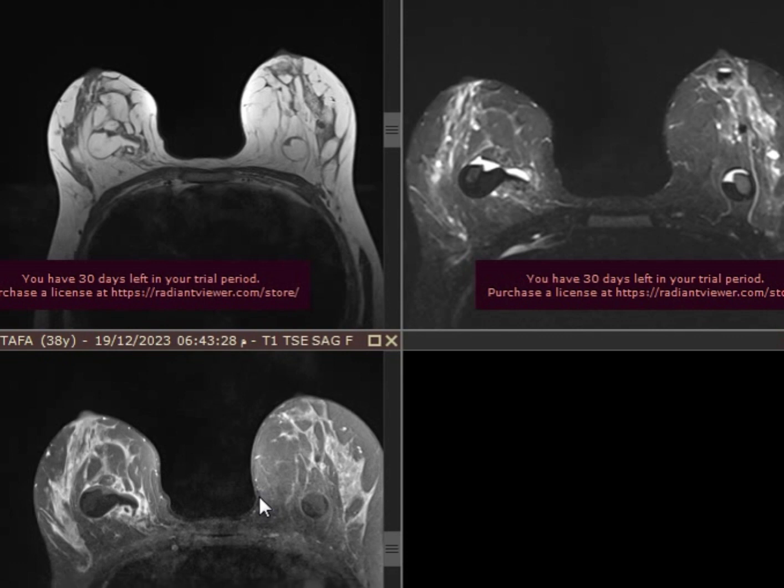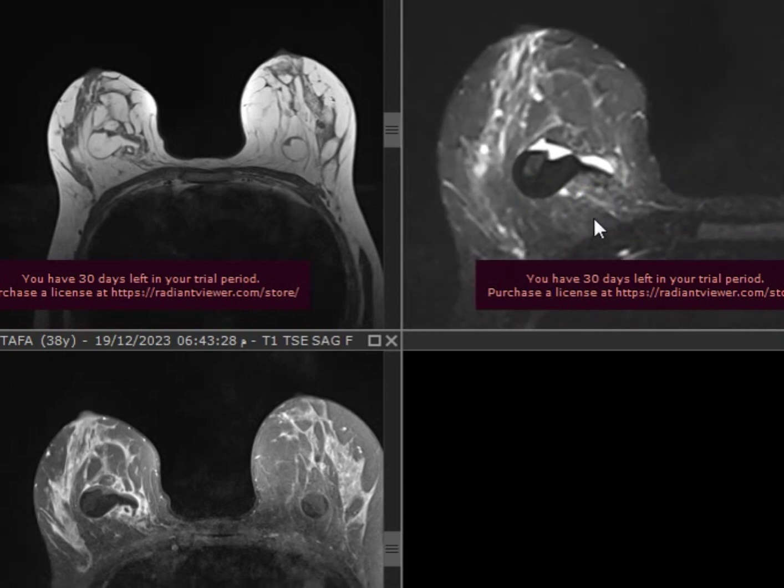However, the question is the following: which one is less dense, fat or fluid? Fat. So fat floats. The fat will always float. Now, let's look here. Please keep quiet, let us think. This is the fat because it's suppressed, and this is the fluid. Which one is floating? Fluid. So we said the fat should float.